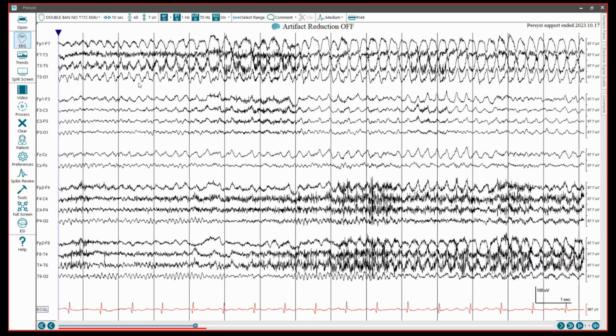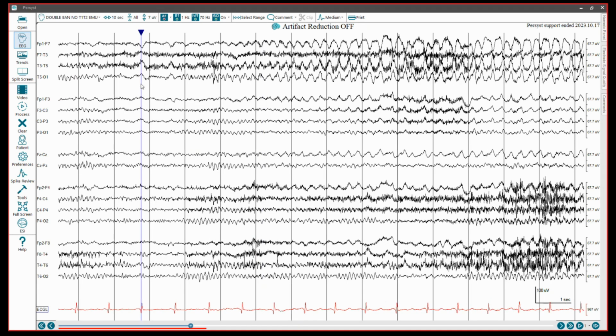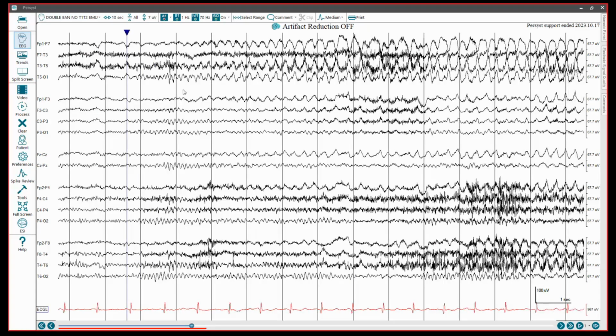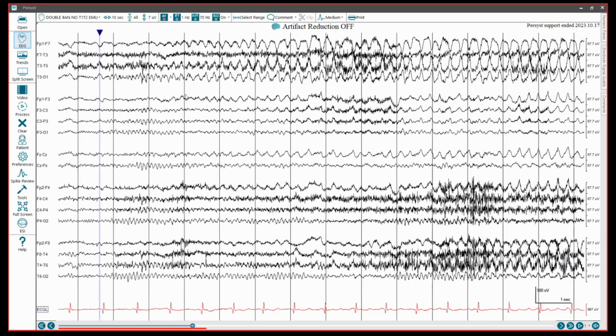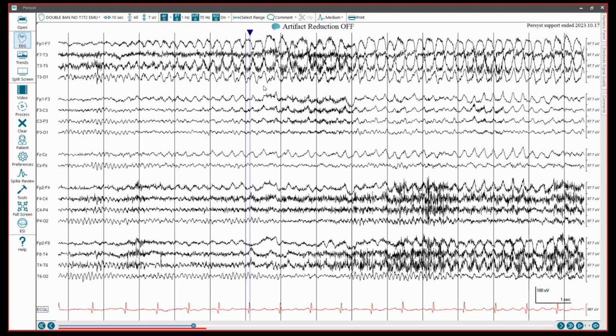Now, as the seizure progresses, we see evolution, and more specifically, we see a morphological transition, a change. It kind of grows, it evolves. So there's an amplitude increase, first of all. We also see a decrease in frequency. Really, the seizure, you could make the argument, perhaps, at least from surface EEG, starts with this sharp wave discharge and this sharp wave discharge. And then immediately after that, we see this rhythmic 4 hertz activity. But as the seizure progresses, it slows down a bit, to maybe 3.5 hertz. So you could fit maybe 3.5 of these sharp waves within a second.